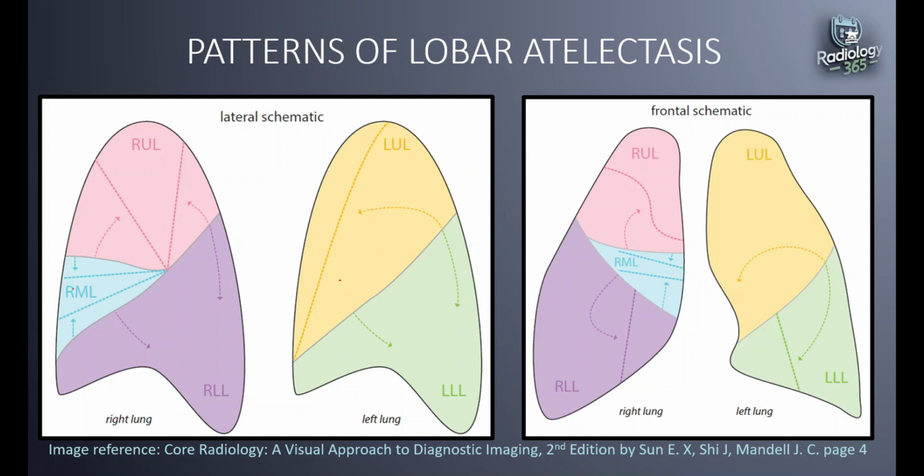You don't have to memorize it. Just understand that the adjacent lobes would inflate to fill the space. For the left lung, if the left upper lobe were to collapse, the left lower lobe would inflate, hence the fissure would move in this direction, and vice versa. Just thinking about it in that way would help you remember the movement of the fissures.